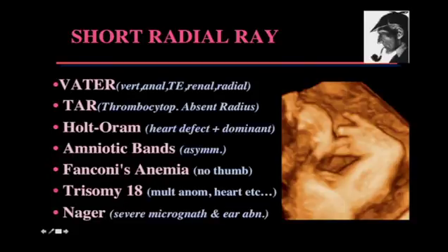We also talked about amniotic bands being responsible for a lot of asymmetry and asymmetrical destruction of different parts of the fetal body, including an arm. This is usually asymmetric when it's amniotic bands, and it tends to be symmetrical when it's some of the other features, other syndromes.